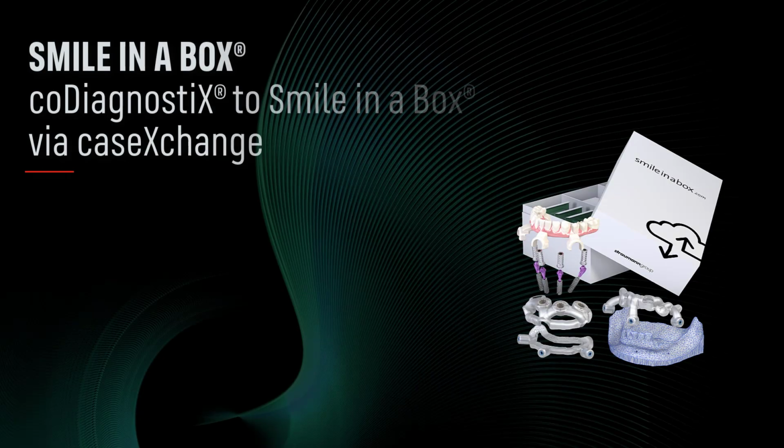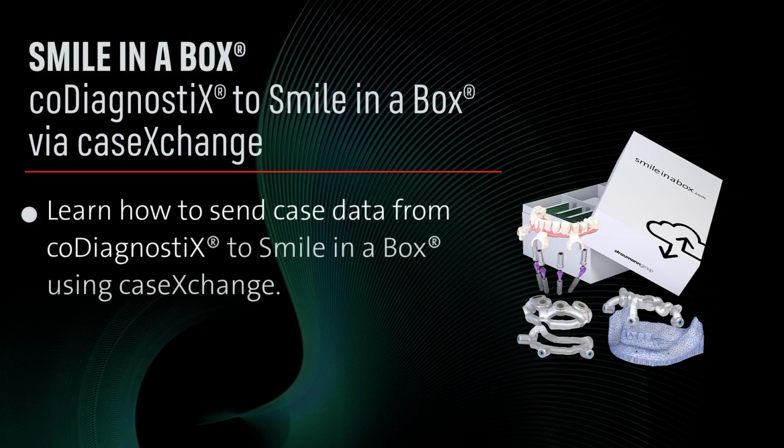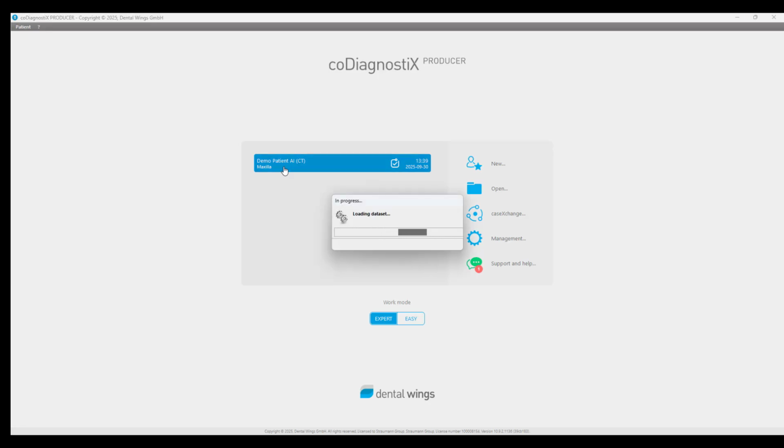Smile in a Box, coDiagnostiX to Smile in a Box via caseXchange. Learn how to send case data from coDiagnostiX to Smile in a Box using caseXchange. caseXchange is the direct connection from the coDiagnostiX software to the Smile in a Box service.